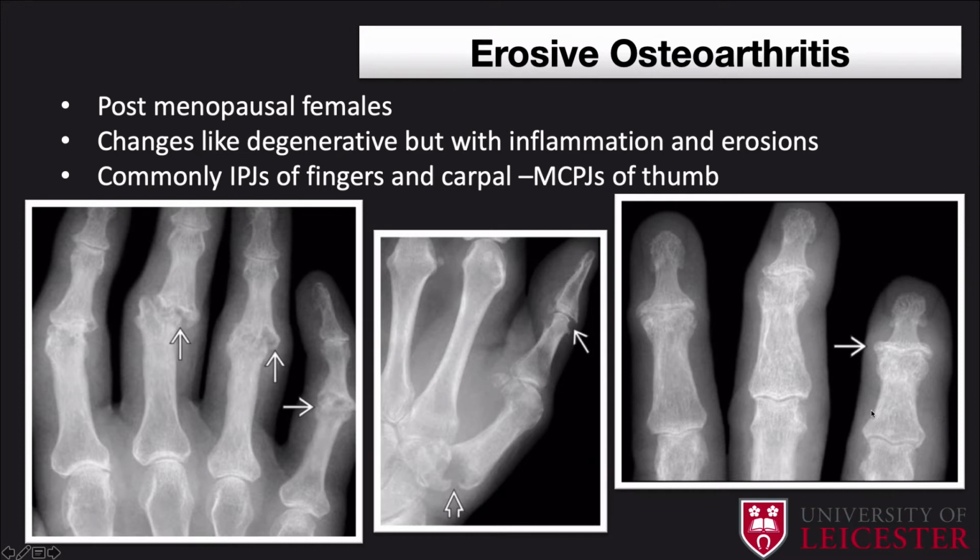Here you've got a PA radiograph showing the joint space narrowing, and in this case one of the hallmark features is actually a central erosion. We call this a gull-wing appearance, where you've got a central erosion just present, and this typically is pathognomonic for an erosive OA. So what other hallmark features do you need to be aware of?